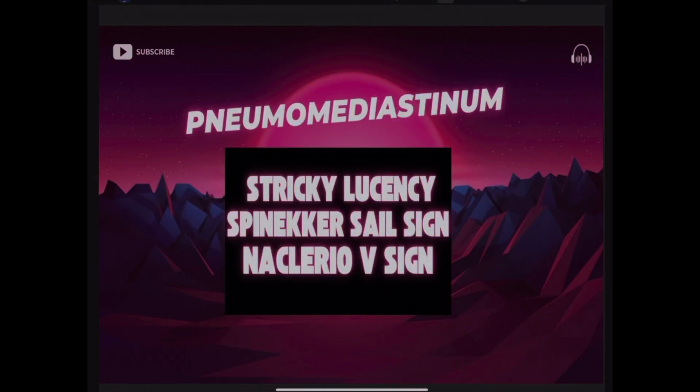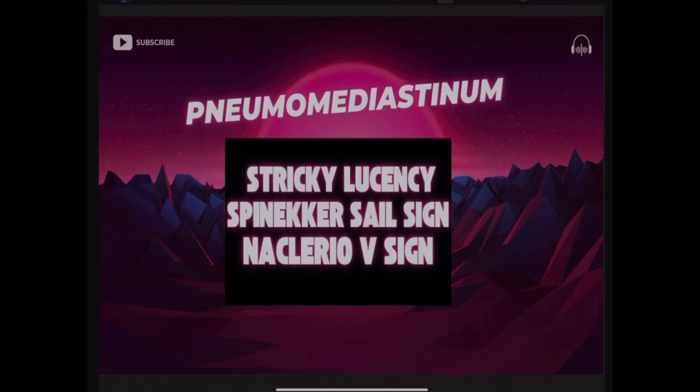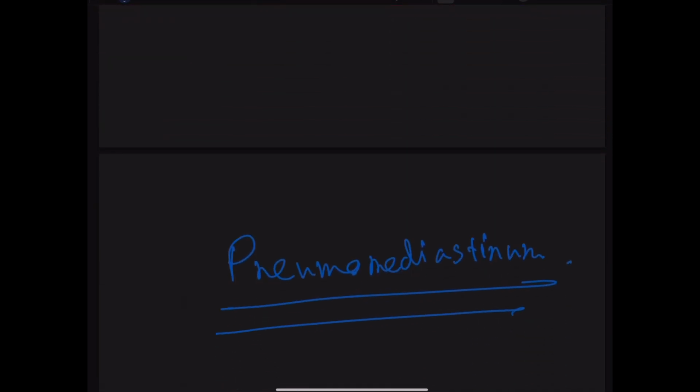So in this video, I'm going to talk about pneumomediastinum, and we will see the streaky lucencies. We can see the spinnaker sail sign, and we will see the Naclerio's V sign, and we will also talk about the causes of pneumomediastinum. So let's jump into the study.